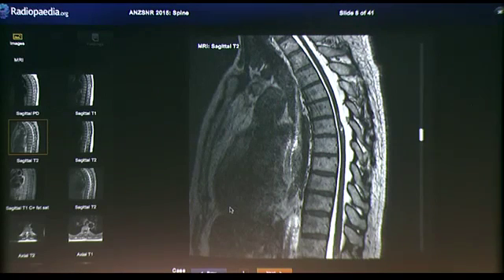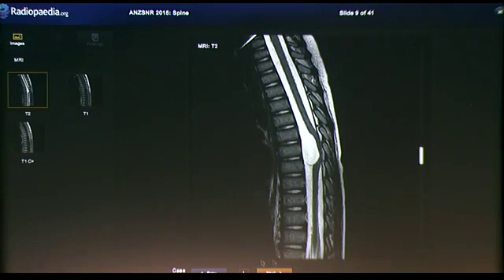For the third of the pathologies that give rise to a similar appearance, this is kind of a pre-case rather than the one I want to talk about in more detail. The third pathology is dorsal arachnoid cysts, and these can be extremely subtle, and you often have to suspect the diagnosis so that you can go on to prove it. This is actually an arachnoid cyst, which is an obvious finding, displacing the cord posteriorly, thinning it. And this one's nice because you can actually see a cyst wall coming around.